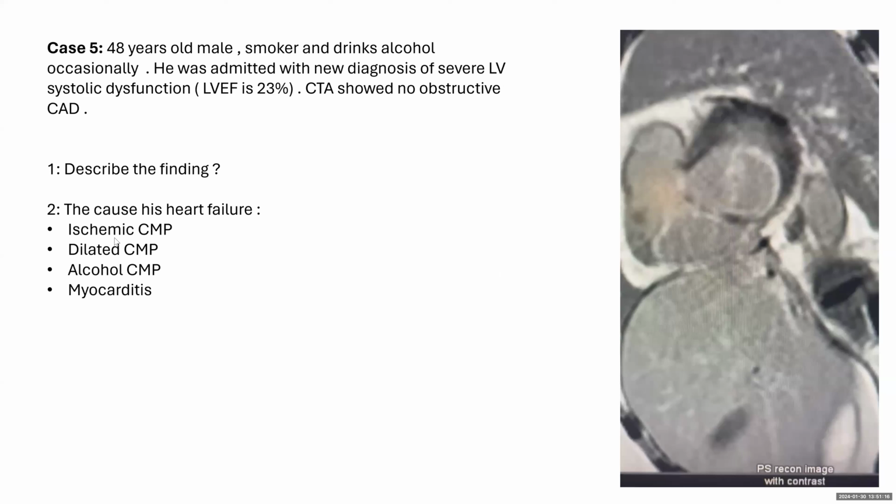And the reason for that is, number 1, this is not ischemic cardiomyopathy. This is very focal and does not correlate with the ejection fraction. It's not extensive ischemia.